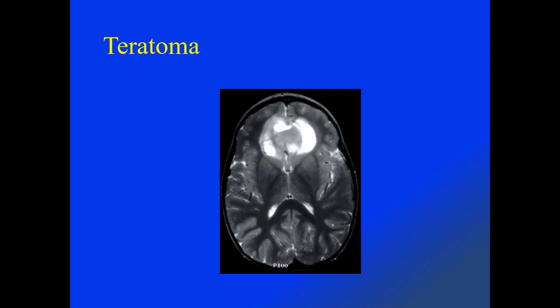The MRI images again demonstrate the heterogeneity of this mass with very little surrounding edema.